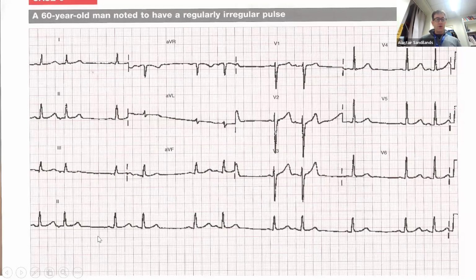Okay, so when we're looking along this rhythm strip to try and understand which bits of the signals look the same, ask yourself what looks exactly the same on all of these beats. What looks the same is the QRS and then the T wave, QRS T wave, QRS T wave. They all look the same shape, same height. They all look exactly the same. So what does that suggest to you? That suggests that conduction from the AV node down on all of these beats is the same. It's common to all of them.